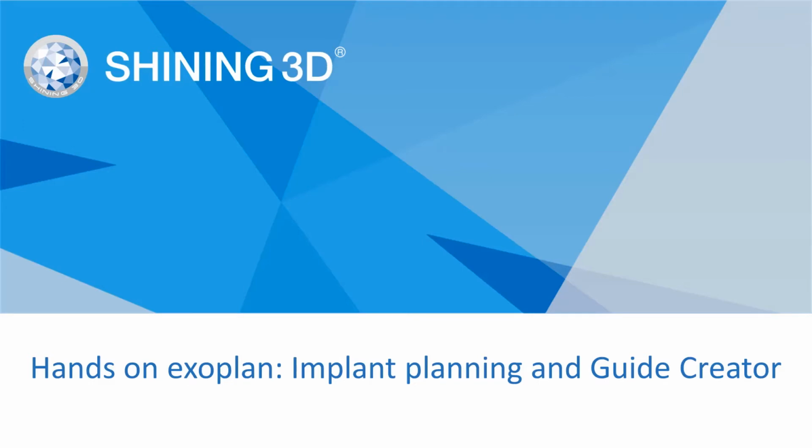We can now start our demonstration through the implant planning and the design of the surgical guide. If you have any questions about the process, please feel free to leave your comments and we will get back to you in real time and also during the Q&A sessions.